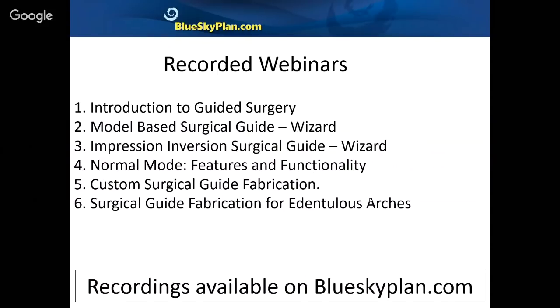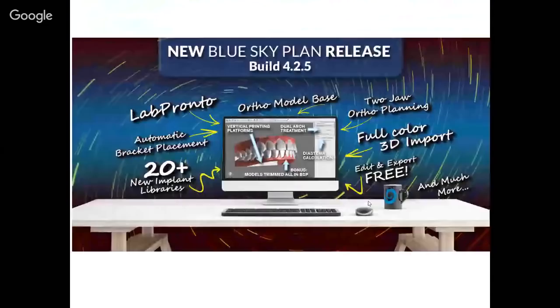the series with the 7th presentation on the orthodontics module integrated into Blue Sky Plan software. We're using build 425, which is public on the Blue Sky Bio website. Includes a lot of new features and functionalities, including 2-jaw ortho planning, which is going to be the focus of today's presentation.